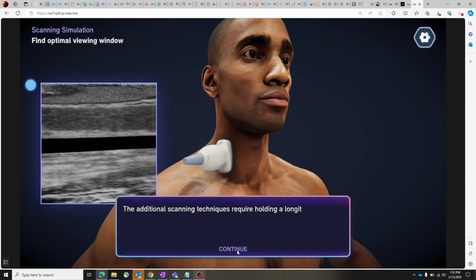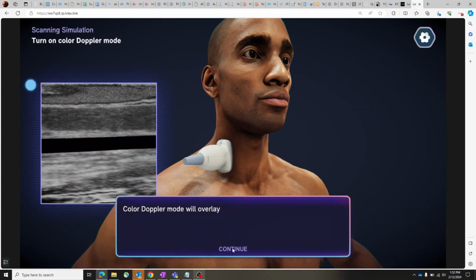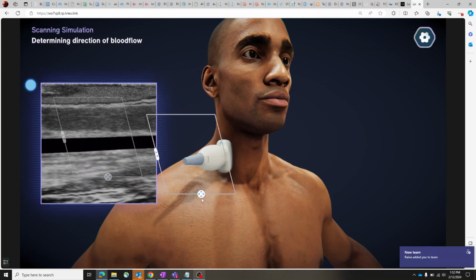That's the hardest one. All right. So yeah, that concludes the demonstration of the game. And yeah, obviously meant to be played again and again, used as a sort of refresher.